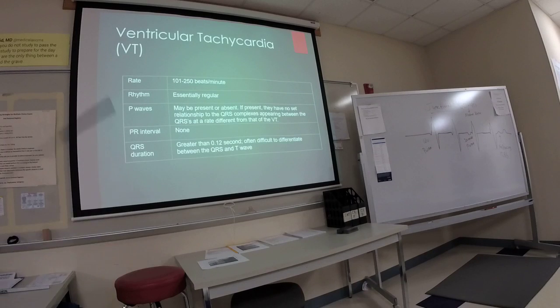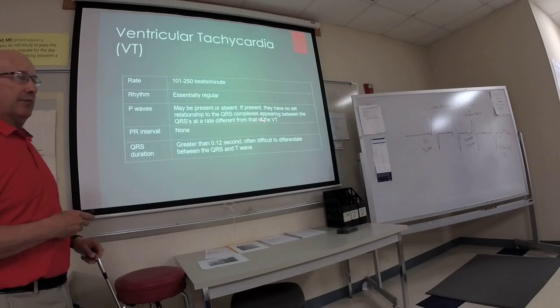Okay. Are we good with those rhythms? Ventricular rhythms are easy. Wide QRS complex. VTAC, 100 to 250 beats per minute. It's a regular rhythm, okay?